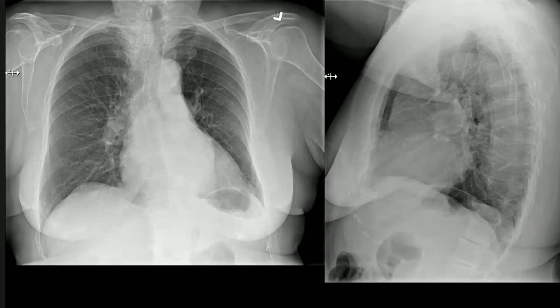Okay, so next, I would like to confirm my finding. I can perform an ultrasound neck and or I will proceed with a CT neck and chest with contrast. So another thing, this is called a satisfaction of search error. You saw one opacity and you said that there could be nothing else, right?